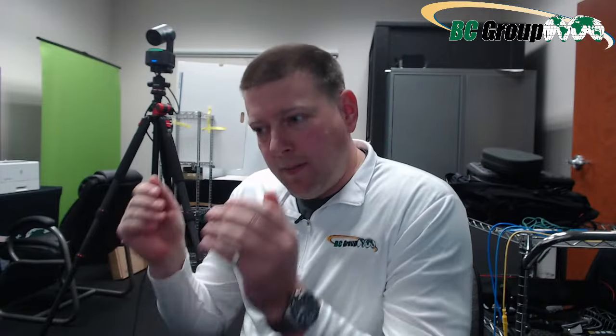So today we're going to cover theory. We're going to cover different types of ESUs because there are some pretty big differences, and ESU technology has migrated to newer tech, which is over there on the side. We're going to cover that as well. Some people are always questioning us, like, why would we need some of the latest and greatest ESU analyzers? And that is because some of them are much more capable than others, and we're going to go over that, okay? So today is going to be an operational overview of ESUs and the analyzers.